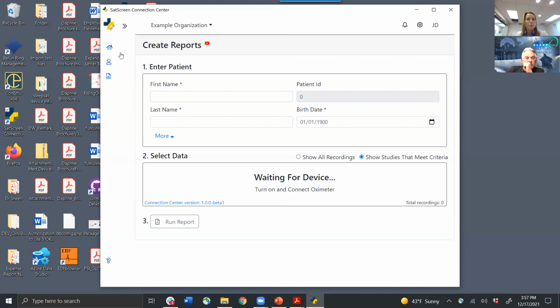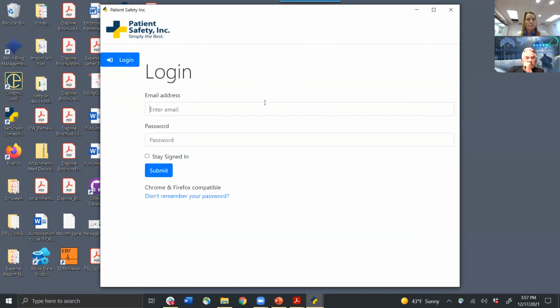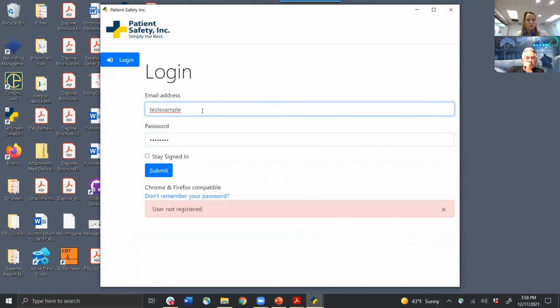You can create your reports, you can view your patients. Sorry, I believe I'm not logged in right now, but you can do that all right here online with us as well.